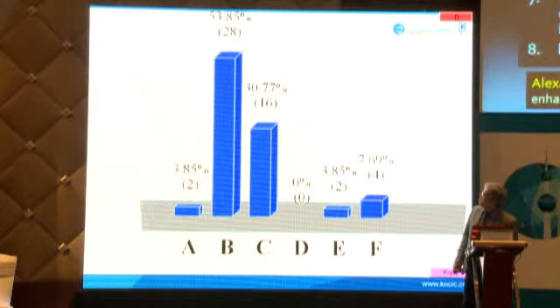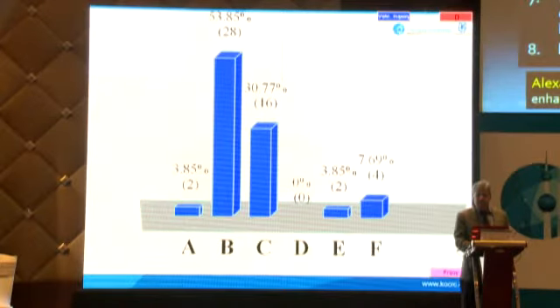So, well, not bad. Some of you got the answer. That was number 3, Alexander's. And some of you thought of megalencephalic leukoencephalopathy because I said large head. So, this is very straightforward. Again, involvement of the anterior white matter is Alexander's.